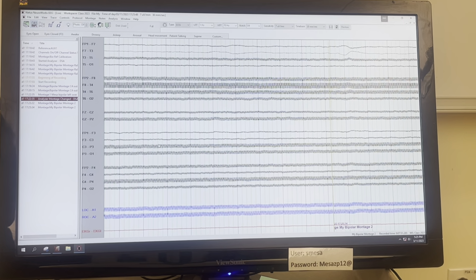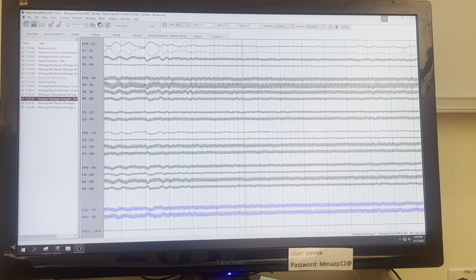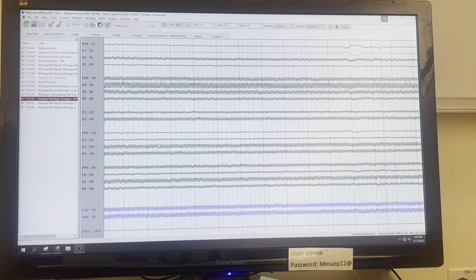So that's pretty much it. When you're in surgery, there's a lot of this type of stuff to do. You have to use the editor, and it takes quite a bit longer to program for multiple channels. Like in surgery, for a grid, you may have 64 electrodes. But it's pretty much the same thing, just a little more complicated. But this is how you create a new montage, edit, and copy montages.